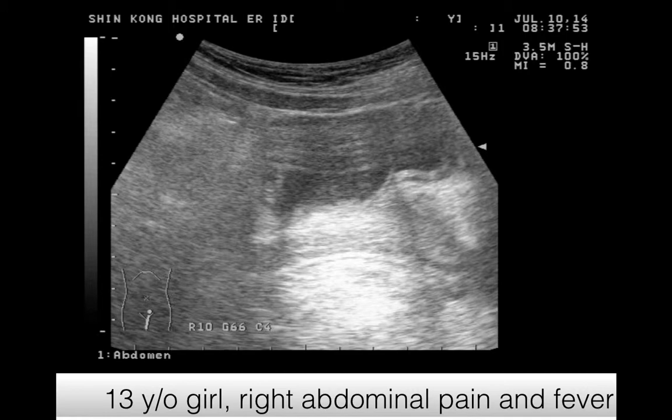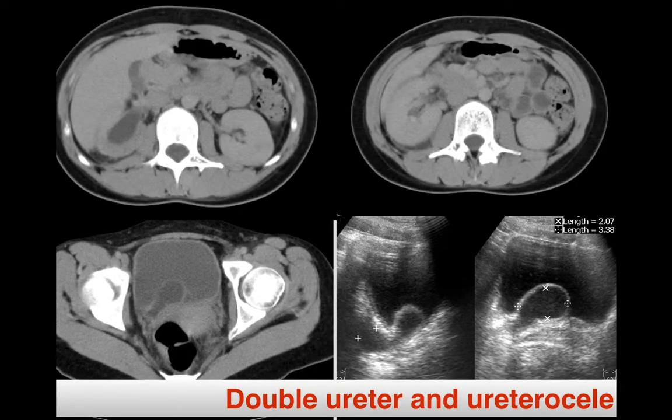I do not show the other side. The right side also got abscess. So this is the CT scan of this girl. We need to arrange different phases. This is the dilated ureter, hydronephrosis. Here, this is the problem one. This one is a normal one. So this girl also got duplicate ureter. And then the problem one also has a ureterocele, just like this one.